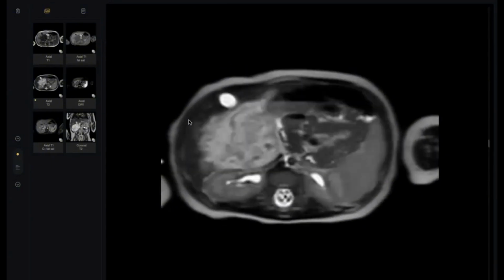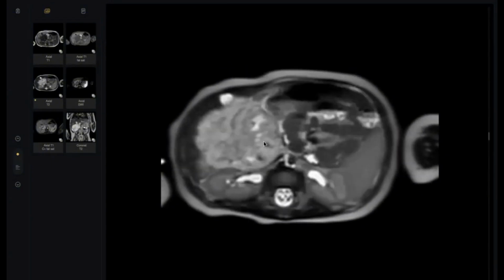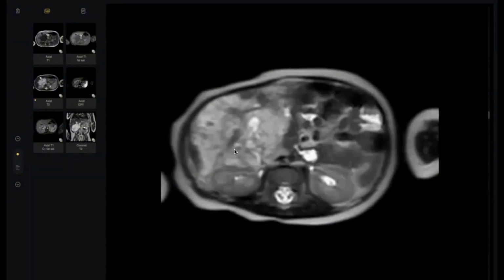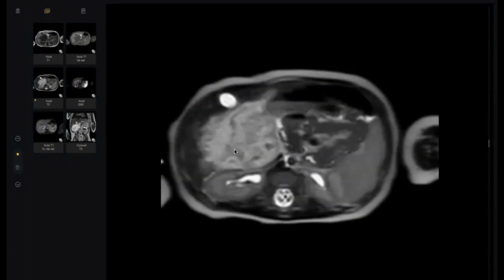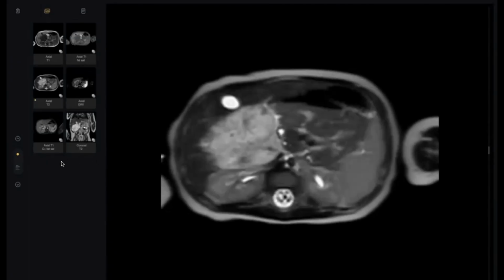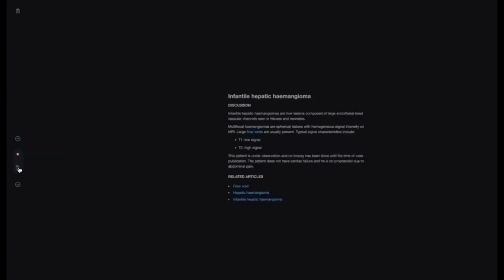Okay, what is this? Sir, a T2 bright lesion. Sir, I could appreciate certain flow voids, I think, present. What do low areas likely mean? Sir, there are low areas, they could represent calcifications or phleboliths. They could represent tiny calcific foci.